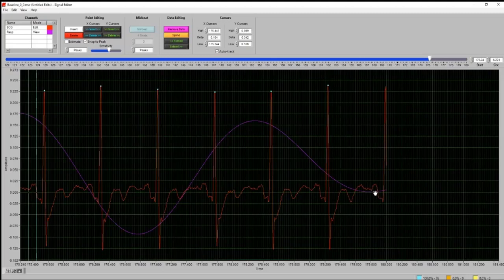But if we did want to use this, we can confirm that P wave, Q, R, and then it looks like it's dropping back down. And this is really fundamental to ensuring that we're getting the right point here, is that the signal does drop back down on the screen. If it's still rising, we really wouldn't know where that maxima lies. And so we wouldn't want to include it on this segment. In this case, it's falling back down.